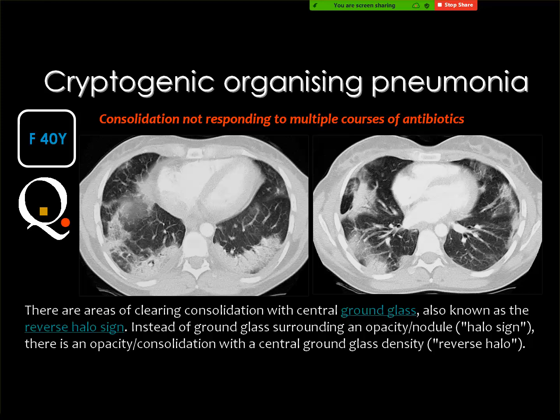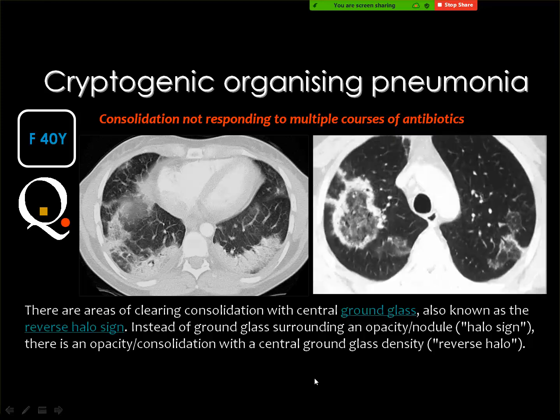No, it's not an essential finding, but the essential finding is you see what looks like pneumonic patches that do not respond to the antibiotic therapy, especially if this is a relatively chronic, or I can say a lesion that is not acute. But if it is acute, then you consider the possibility of acute eosinophilic pneumonia. Yes.